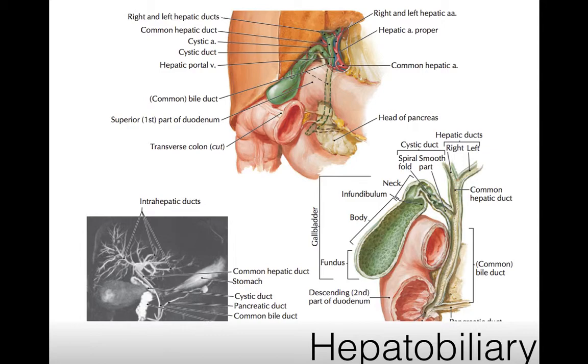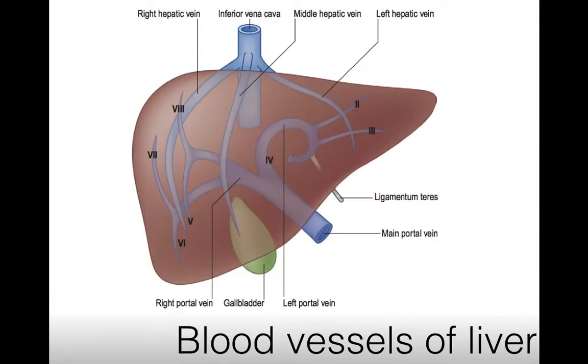Why? When the gallbladder contains fluid, it looks like a gallbladder. When the gallbladder contains some gas, it will interfere with the stone, so it may cause some confusion and problems. This is the ER GB, so we can look at the detailed situations. All of you are familiar with that, so we give a brief introduction. When we look into the hepatobiliary system, we have to have a brief introduction of the anatomy and then the sonographic appearance of those structures.